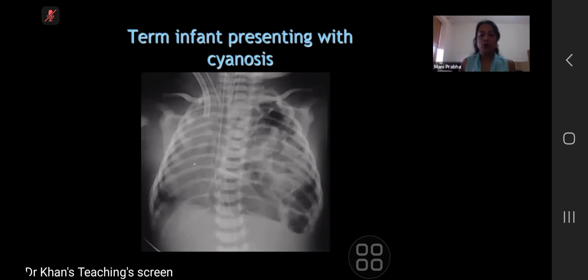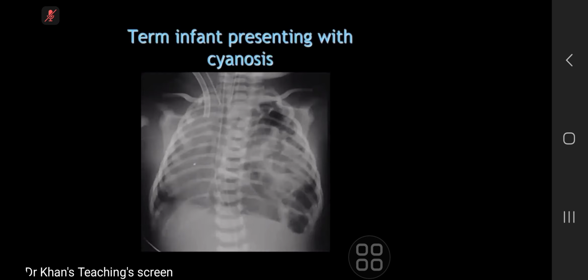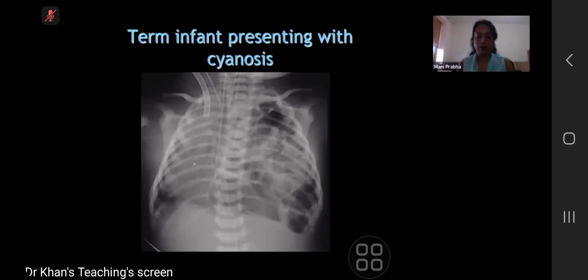Any differential you would like to keep in such cases with this kind of appearance? I think I can see mucosa around the air bubbles on the left, but with other multicystic lesions in the lung, it could be a CPAM, congenital pulmonary airway malformation. Yes, you should keep that differential always. This was indeed a case of congenital diaphragmatic hernia, as you rightly described, and most of the time you would see this kind of appearance rather than the initial case which I showed you.